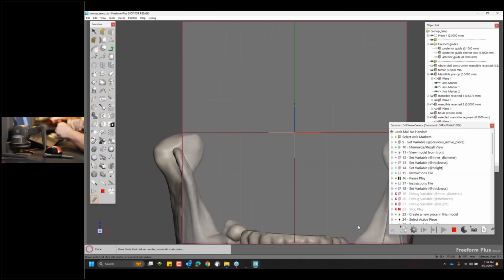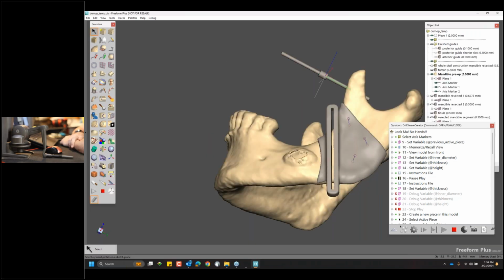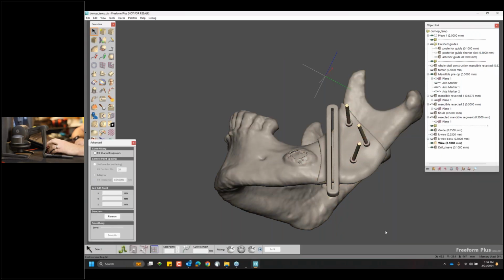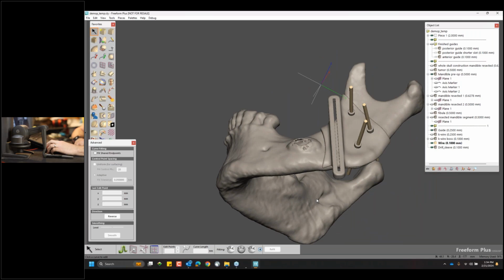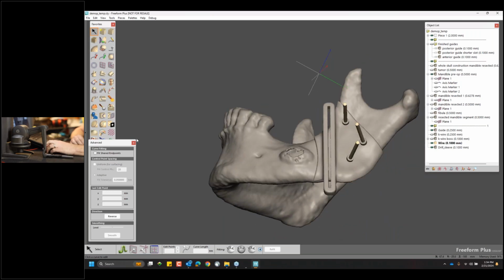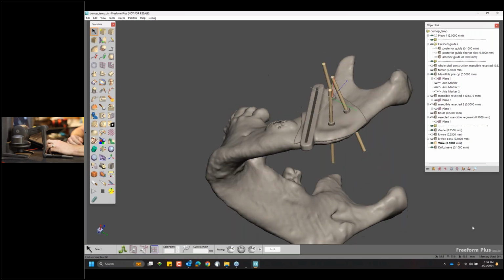And now I let the computer do the driving. So it's going to create the object, and then it's going to select it and manually pattern it, create it, and clean itself up. So now I didn't have to do any of that work. All I had to do is feed in a couple parameters and we are done. So there's an awful lot of power with a little bit of effort of doing some of that work ahead of time for automation.